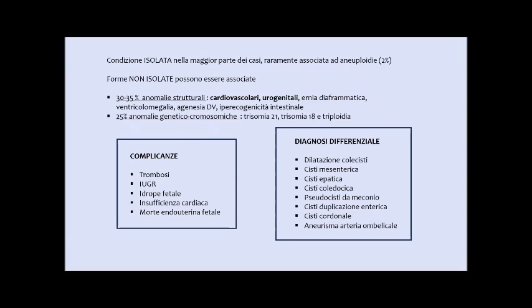It is important to note there is a range of differential diagnoses, including other cystic and intra-abdominal formations, which are listed here. This includes a gallbladder dilation, along with mesenteric, hepatic, and choledochal cysts. Cases of enteric duplication cysts are all formations that can be easily differentiated initially by using color Doppler. In fact, they are all cystic intra-abdominal formations, but they lack vascularization, unlike ectasia of the umbilical vein. The cord cyst is usually found in the extra-abdominal tract or along the course of the umbilical cord, and as such is negative on color Doppler.